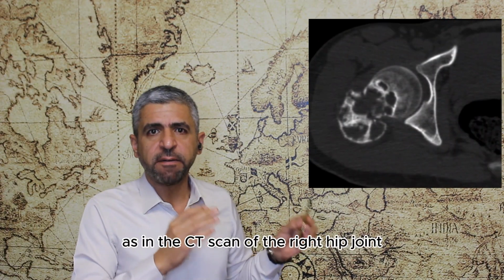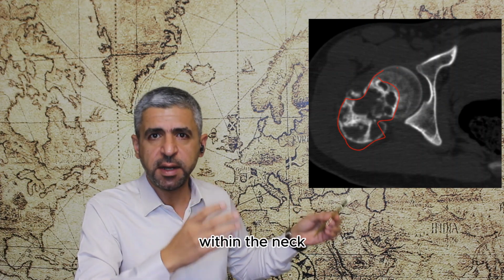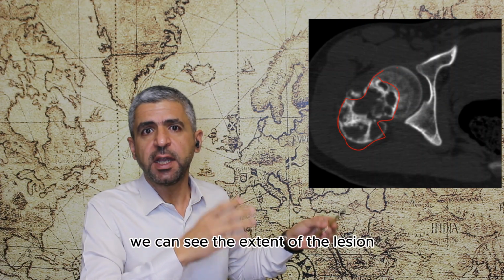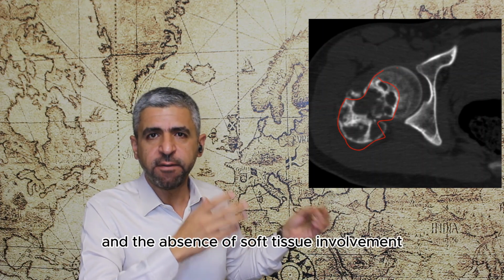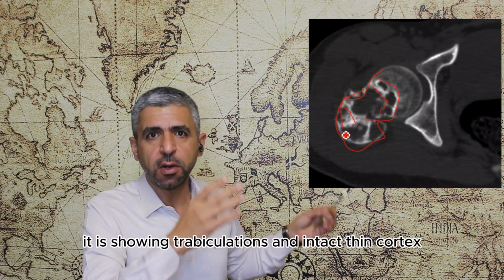As in the CT scan of the right hip joint showing an aneurysmal bone cyst within the neck and the greater trochanter of the right femur, we can see the extent of the lesion and the absence of soft tissue involvement. It is showing trabeculations and intact thin cortex.